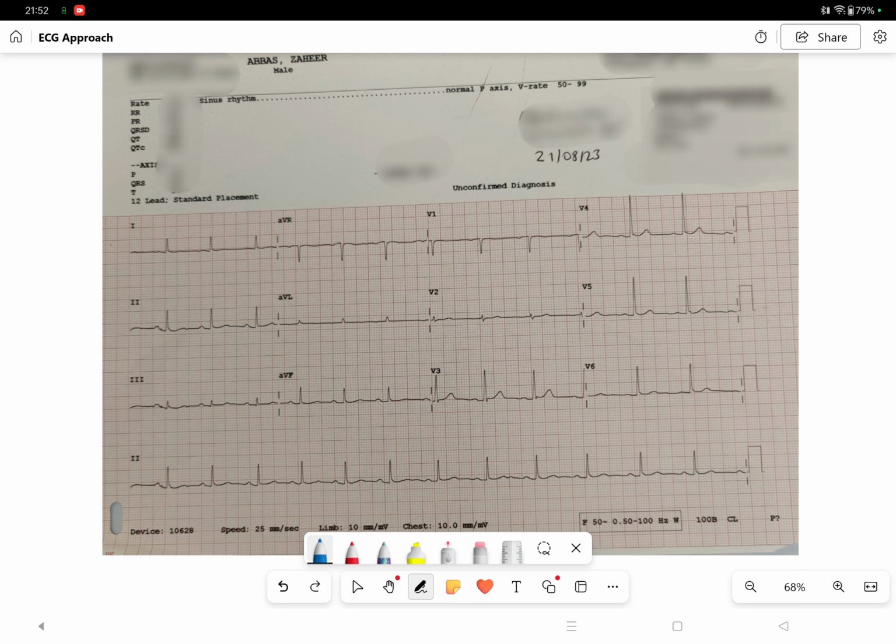Okay, so first and foremost, what we're going to look at is the actual details of the patient, and you need to understand that we need at least 2 patient identifiers. And the 2 identifiers I'm going to use here are the name, and I might use the date of birth, which I've not put on here. You could use the NHS number, or you could use the hospital number as well. So these are 2 typical identifiers.